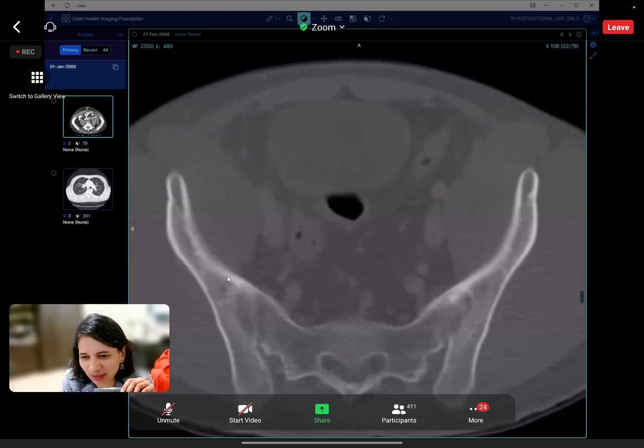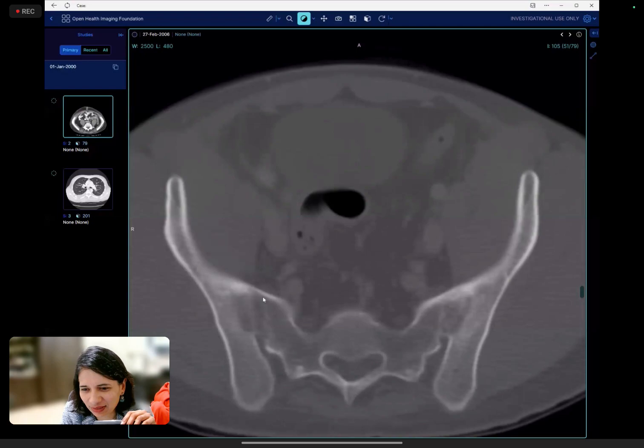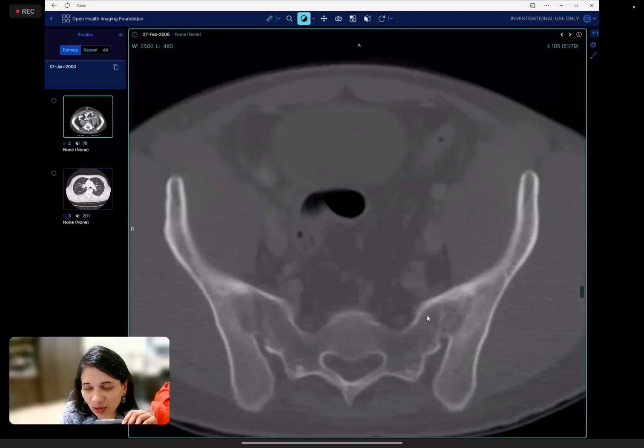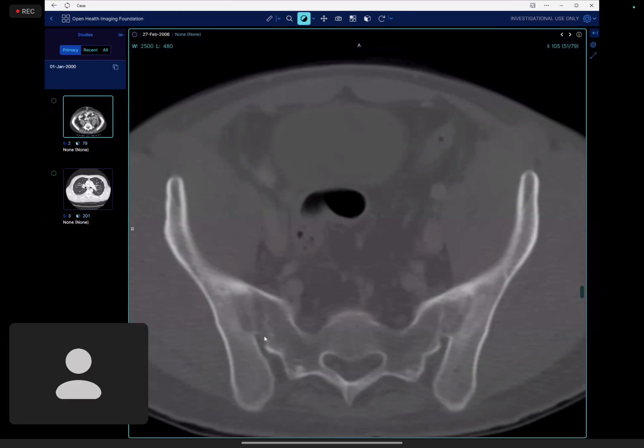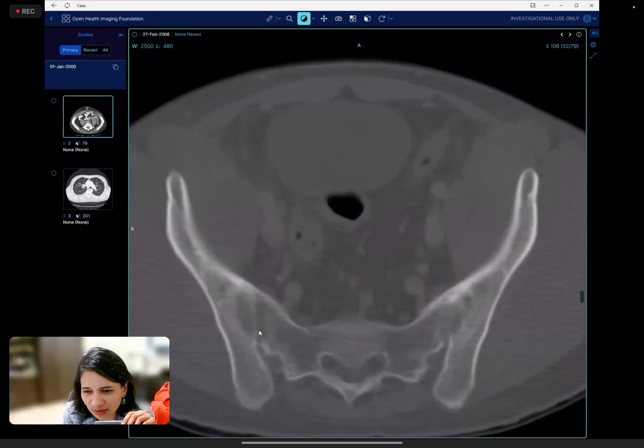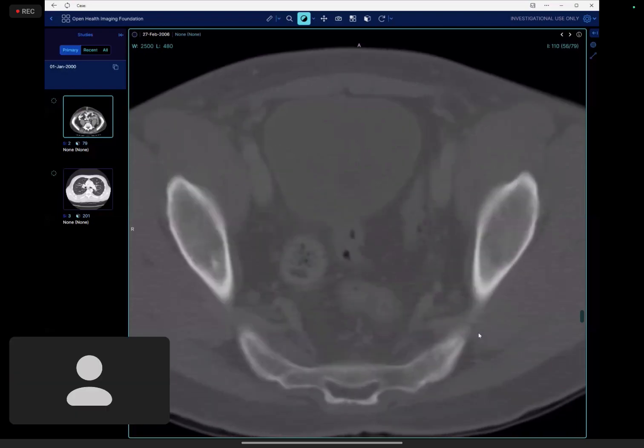Yes, because it's a continuous line, look at that, see? Completely fused. It's not like sometimes you can get what we call flowing osteophyte or bridging osteophyte across, but this is completely fused. You can see that there must have been some erosion or some changes there because it's all loosened here, but it's now fused.